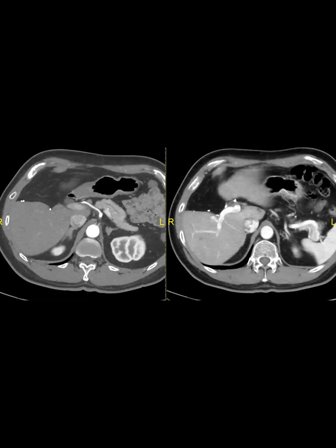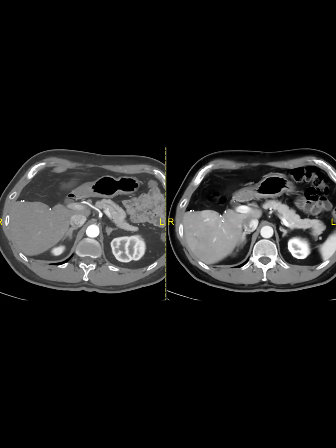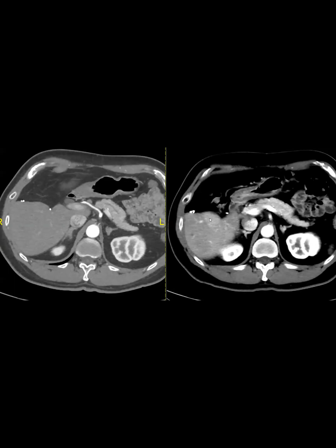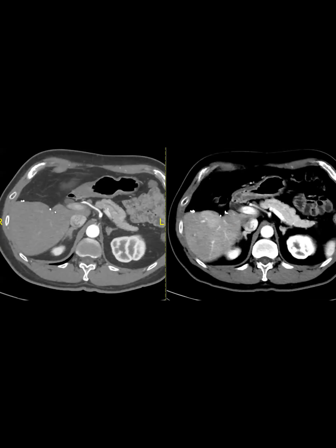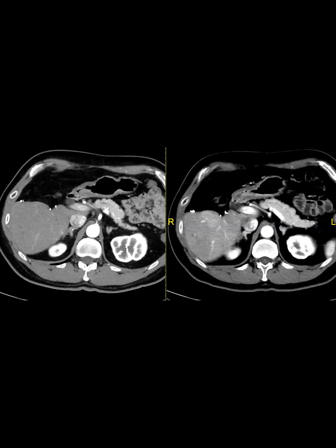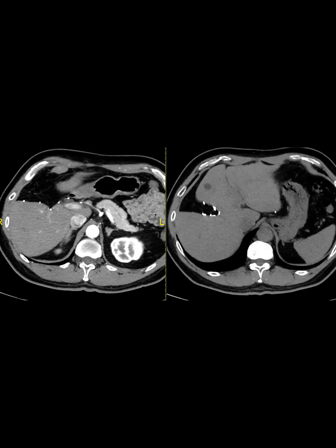Okay, and now this is the case that I've read. The patient does have some patchy areas of perfusional changes. But what caught my eye, let me take away the nod, is that there's a new area of enhancement here. It's very ill-defined. You can see it was not there before. Is there a little bit of steatosis in the background too? Here's the non-con. Probably not.